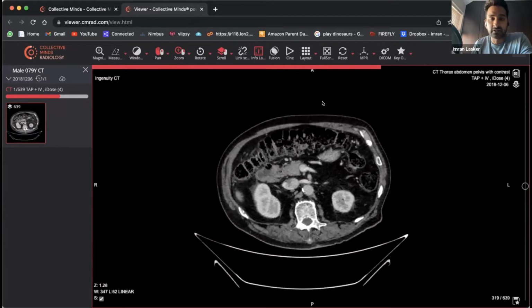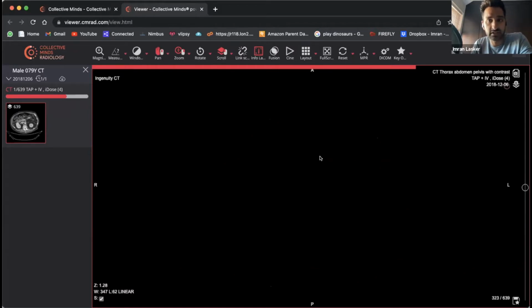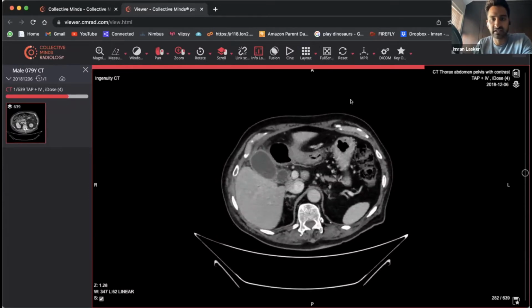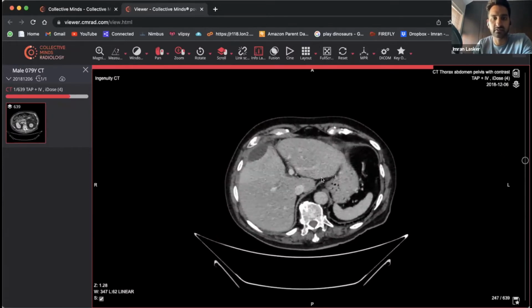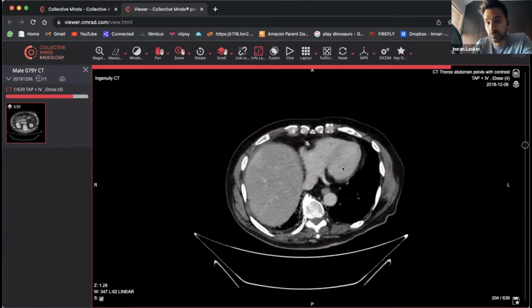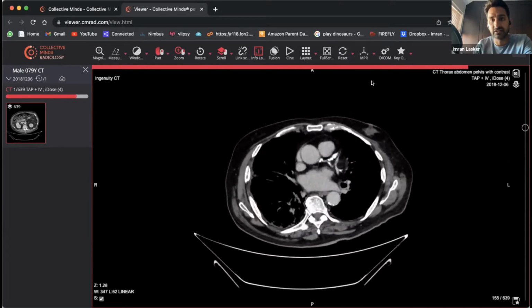Okay, so we are going to be looking at this patient. They have got abdominal pain. And for those of you that are able to get through the scans quicker than me, just go ahead and write whatever you think is going on in this study. I'm going to work through it slowly, so that I understand that not everyone is coming in with the same ability. Some people are ST1, some people are even just thinking about doing radiology in the first place and are very interested in looking at scans, which is a great place to be, by the way.